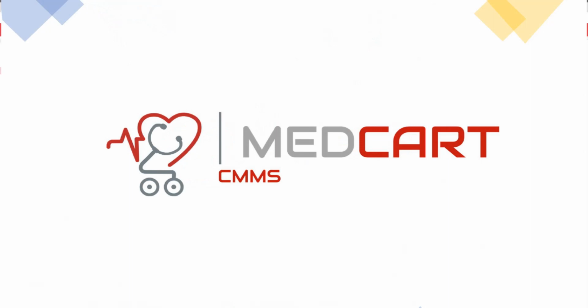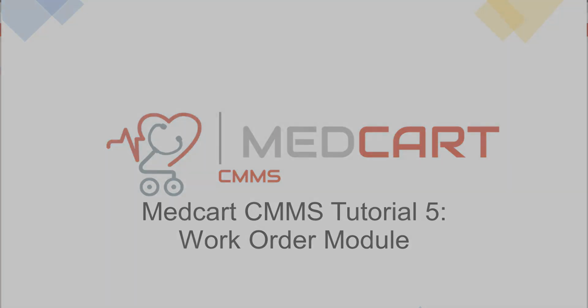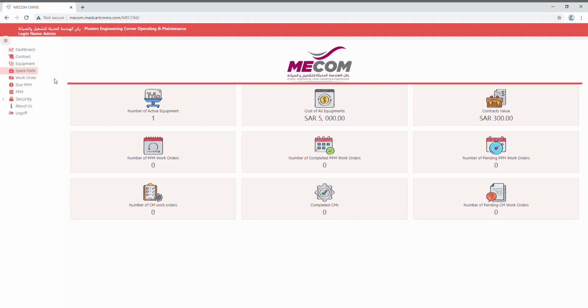Hello guys, we're back again in our tutorial. We already finished the contract tutorial, the equipments and the spare parts. So today we will learn how to use our work order module.